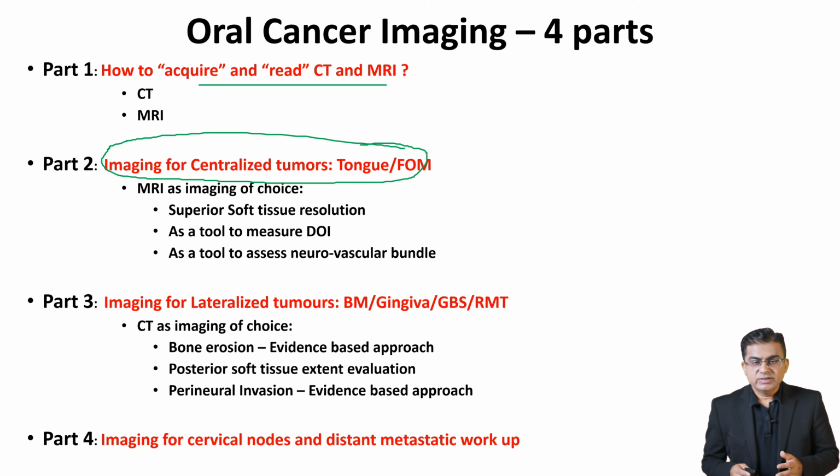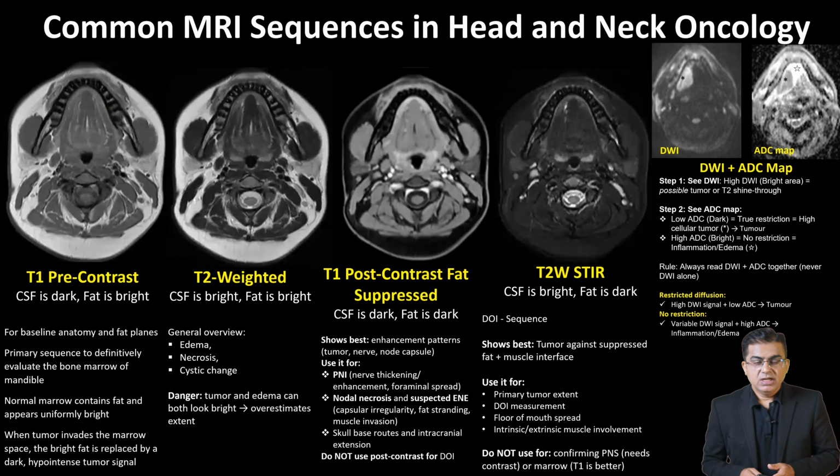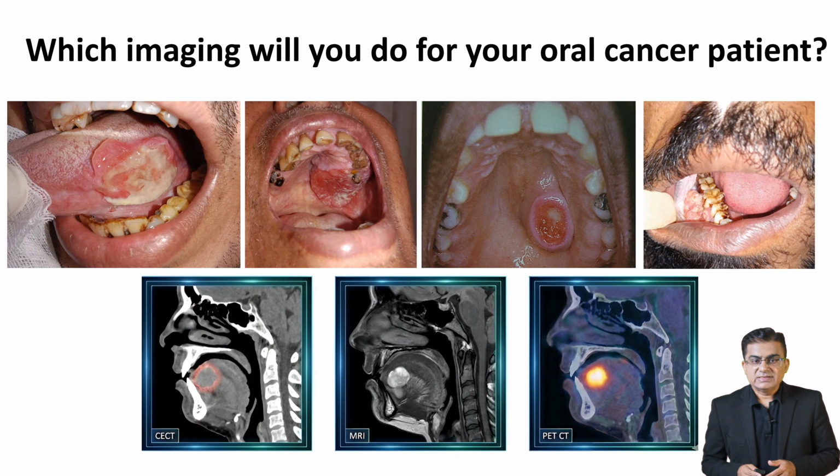These are the MRI sequences for head and neck oncology I showed you in my previous video. I am not going to go through this again. You must go through my previous video on basics of CT and MRI if you have not watched it yet. That video is the foundation for reading MRI. Now let's get to this topic.